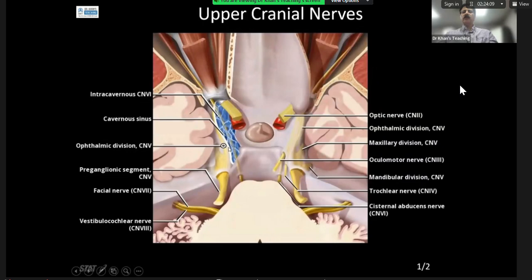So this anatomy is the key. We'll see it as the last case of the day later today. Now, this is the sixth nerve, and slightly more superiorly, the fifth nerve is going anteriorly. This is the trigeminal nerve. It is a big, thick nerve, and we can see it very well on a CISS MRI scan.